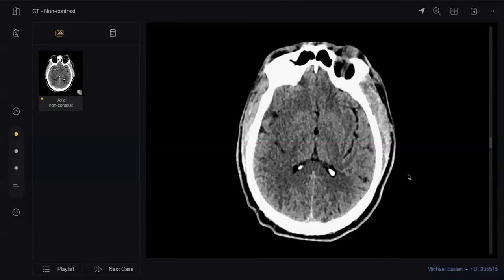Suppose the patient is still on the table and the stroke team tells you to be very sure that there is thrombosis within the MCA. What will you do? Apart from this hyperdense MCA sign, what will be your next step? I can give contrast. Yes, you'll do a CT angio. Not an MRI.